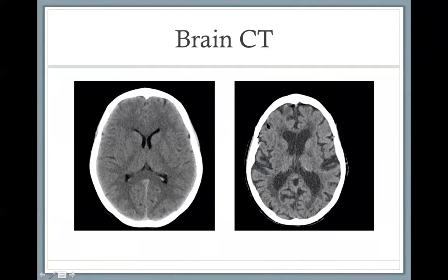For example, this is an older brain, actually very old. You can see that the brain parenchyma starts to shrink. The sulci, which are filled with CSF, start to expand more. The lateral ventricles also start to expand more. So these are both normal for their corresponding age. This is an adult, while this is an elderly individual. So not really a disease, but more like a natural progression.